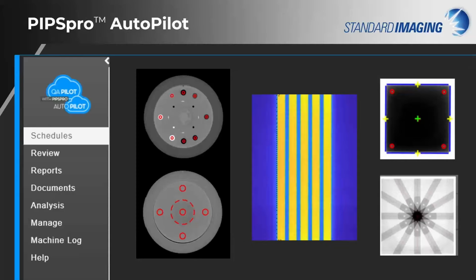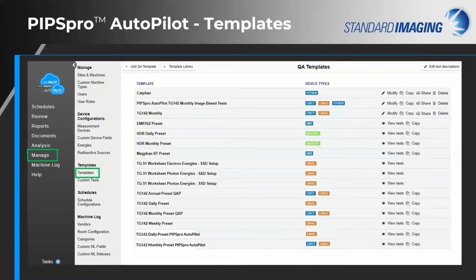This is our new menu, just to show you. As I was saying, whatever type of images you have, you can bring them in and get them analyzed automatically in PIPSpro AutoPilot. I've never had something like this before.